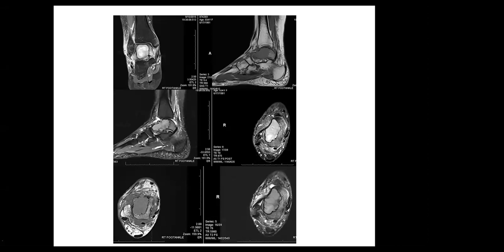With mild joint effusion and soft tissue edema. It seems to be a lesion with no aggressive feature, narrow zone of transition, with slight bone marrow edema.